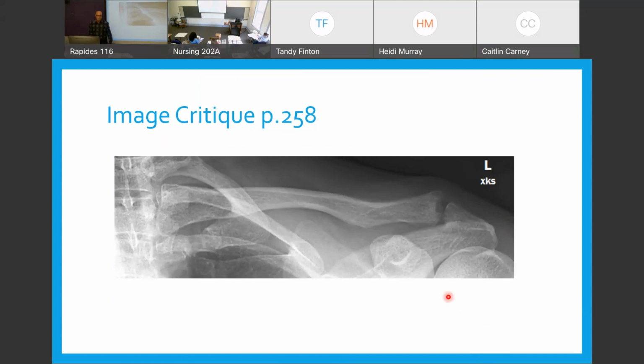Hannah Dowden. What we got? We have an AP clavicle with angulation because the clavicle is horizontal and barely has any real. Very good. And you see, really pretty, you see the articular ends on this one, really pretty. Very good, very good. Everybody hear? Everybody got that?